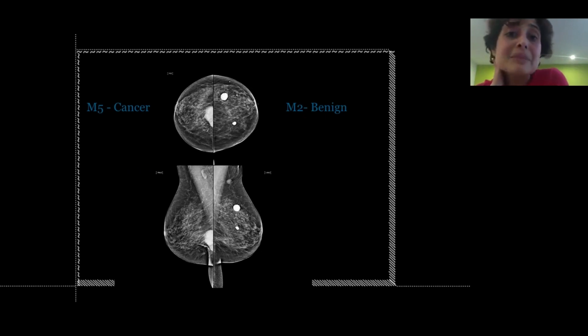There is another similar appearing lesion, which is in the inner half of the left breast, right back from the nipple. So it's in the inner half. This would be at approximately the 9 o'clock position. If you're comfortable, give the clock face, but do not feel compelled to say it. It's safer to say the quadrant. 12 and 6 o'clock, you're safe because you're not going to make a mistake on upper half, 12 o'clock, lower half, 6 o'clock. But when it comes to 3 and 9 o'clock, because it's different for the two breasts, and if you're not comfortable, you don't have to use the clock face at all.